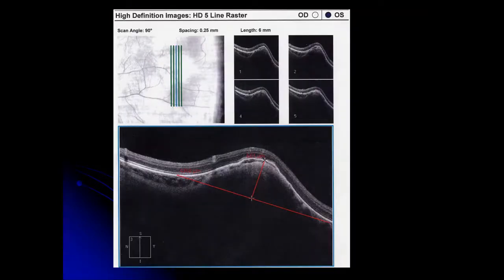And here's the OCT through that lesion. So we can see the lesion is under the retina, under the retinal pigment epithelium. It's affecting the retinal pigment epithelium. And that lesion is elevated by about 2/3 of a millimeter, okay, about 650 microns or so. So we have concern about this. This patient deserves careful follow-up.